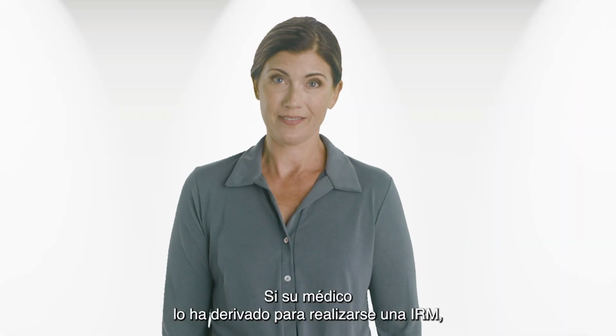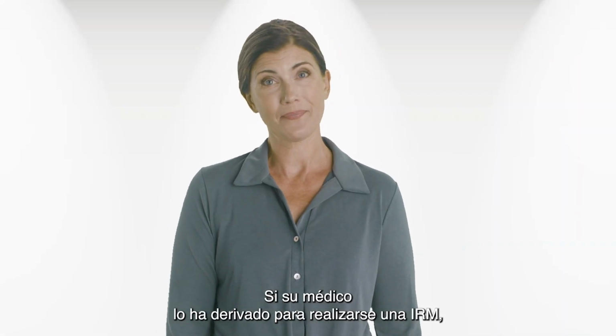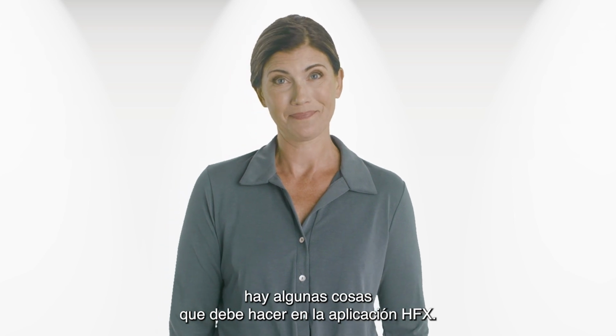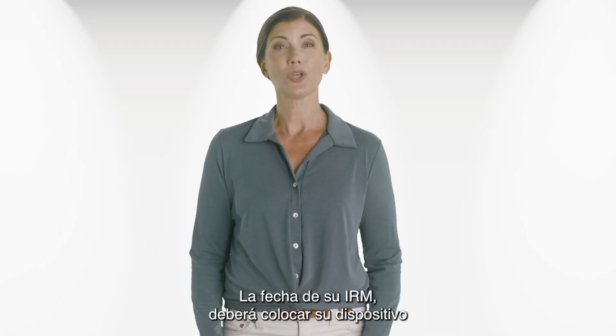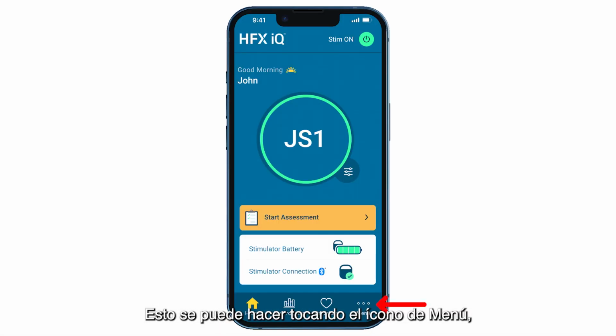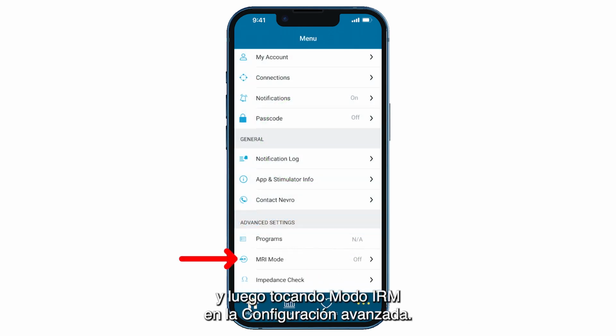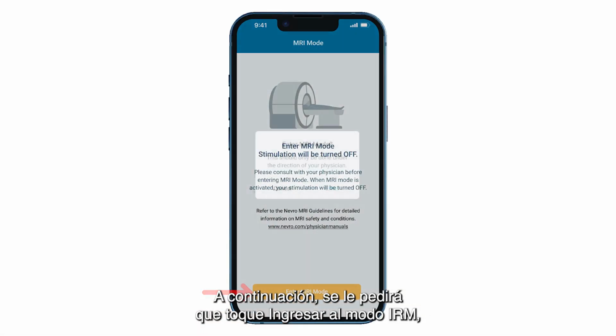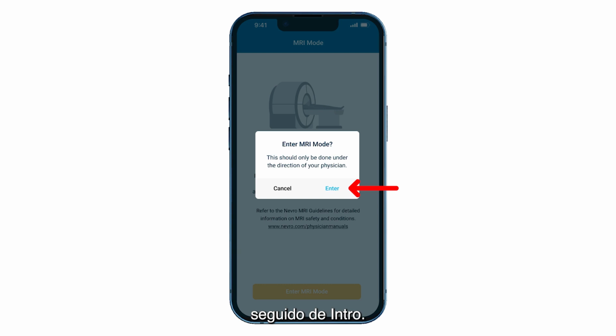If your physician has referred you for an MRI, there are a few things you will need to do on your HFX app. The day of your MRI, you will need to place your device into MRI mode. This can be done by tapping the menu icon, then tapping MRI mode under Advanced Settings. You will then be prompted to tap Enter MRI mode, followed by Enter.